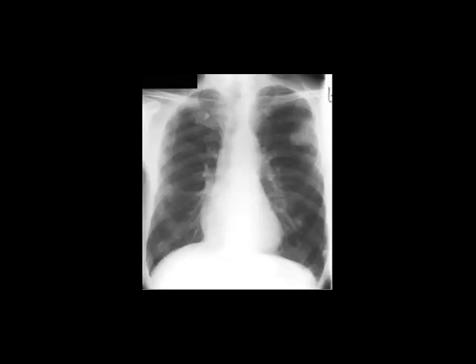So the differential diagnosis will include plasmacytoma, lytic metastasis, fibrous dysplasia, brown tumors. So nice. They mentioned that chondrosarcoma can be, as the commonest primary malignant tumor. But you know that chondrosarcoma is located near the costochondral junction, and it has calcification. So this one is not typical. But you can just mention it in discussion if they ask you. Okay. They mentioned that it's good to look at two regions. If you have a single rib lesion, look in two regions.